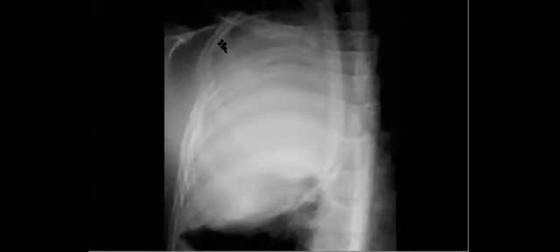Ewing, Askin, Bennett. It can be a tumor like Ewing sarcoma, yes. And Askin tumor, which is a type of PNET. What is PNET? Can you refer it? Primitive neuroectodermal tumor. Perfect, nice. So it can be a chest wall tumor with rib destruction. And as you mentioned, rib crowdedness, at least here you can find something like a soft tissue mass as well. So if it is not, we can just widen your differential. So this entity is a round cell tumor.